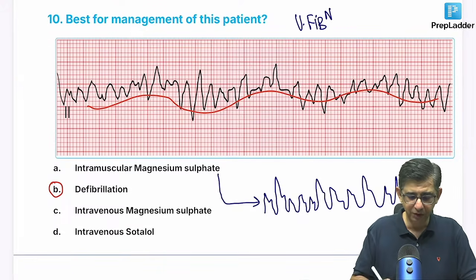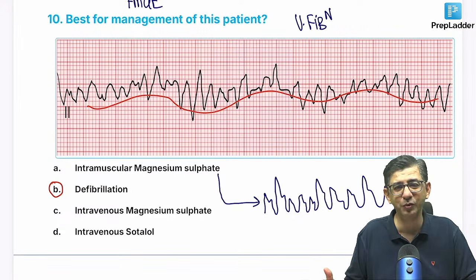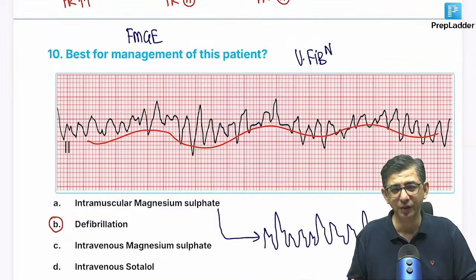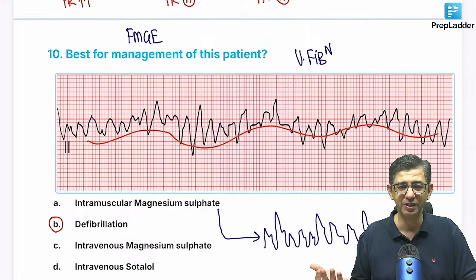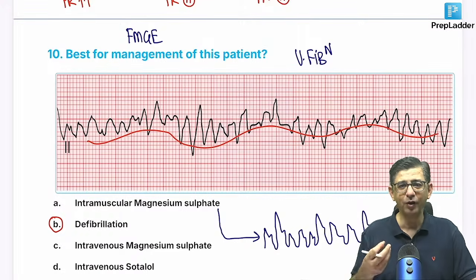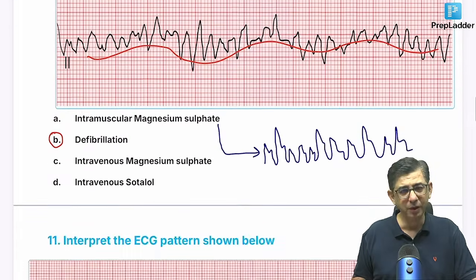तो ये वाला क्वेश्चन है यार, ये जो FMG एग्जाम में है, राइट? अब FMG एग्जाम में वो ज़्यादा 2:1 नहीं पूछेगा आपसे। FMG एग्जाम में वो बेसिक पूछेगा कि भाई वेंट्रिकुलर फिब्रिलेशन बता दो। अब ये तो आसान है ना यार, वेंट्रिकुलर फिब्रिलेशन तो इज डांसिंग अराउंड द बेस लाइन, लाइक बैग ऑफ वॉर्म्स जैसे बोलते हैं ना, बैग ऑफ वॉर्म्स इज लाइक ड्यू टू मल्टीपल एक्टोपिक फोका इन द हार्ट ऑफ द पेशेंट. सो द आंसर फॉर 10th इज ऑप्शन नंबर बी, अ वेरी सिंपल वन.